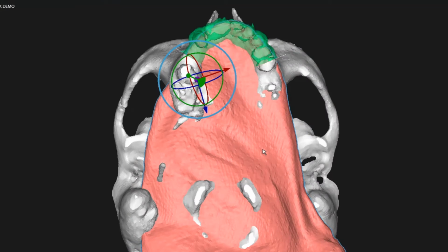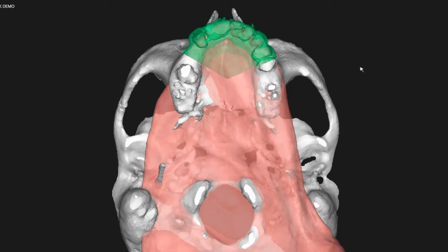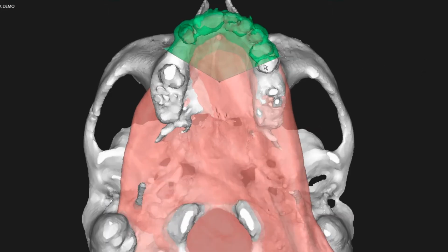So what I'd like to do, just so we're using the full scapula, is extend our resection margin to include up to the first on your left side. Could you extend your green lines, your posterior resection limit, further back to meet the first set of teeth they encounter posteriorly?